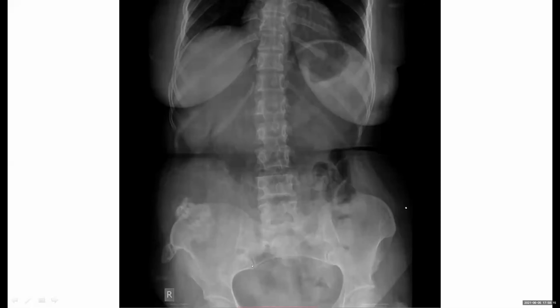Ignore this joint space finding, ma'am. Please concentrate on the lesion and its morphology. This lesion can be a bony lesion, and it has irregular margins and is closely associated with the right ilium.